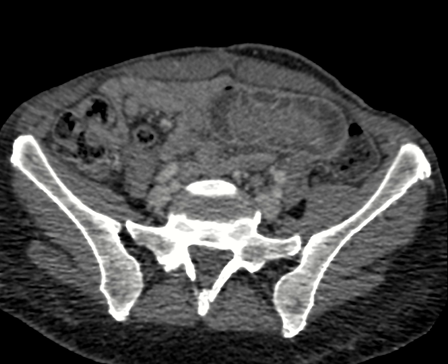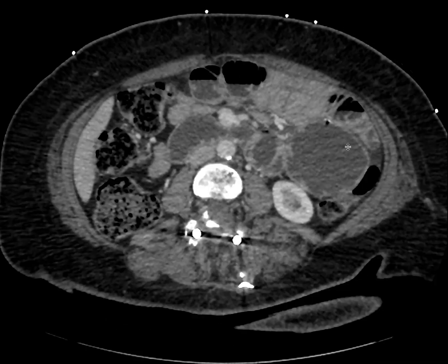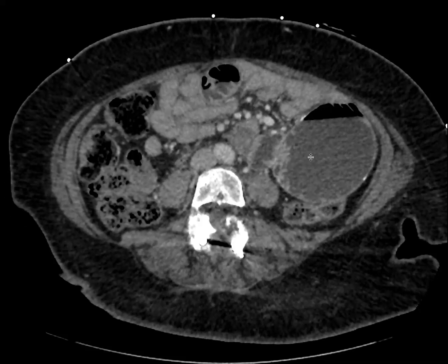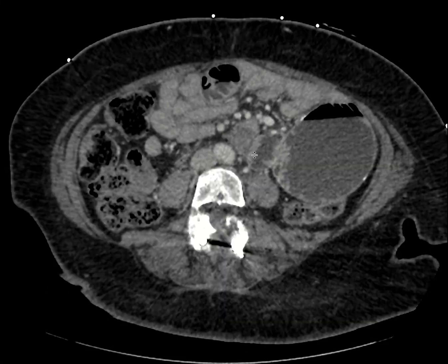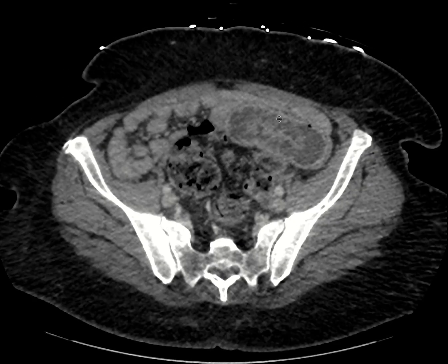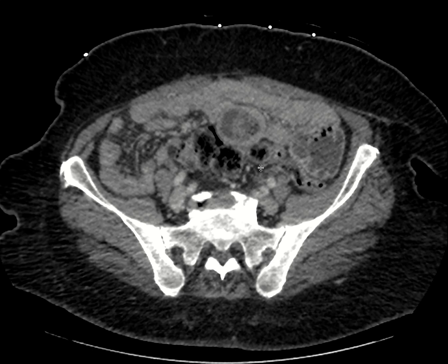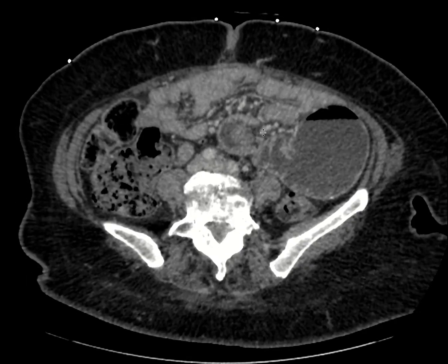Just to show another example of the exact same thing, here's another CT scan where you can see this dilated loop of bowel here, this jejunum, right at the jejuno-jejunal anastomosis. And if we go more distally to this, we can again see a very similar appearance of what looks like thickening, but here we can see the plicae circularis here coming into the jejunal lumen.